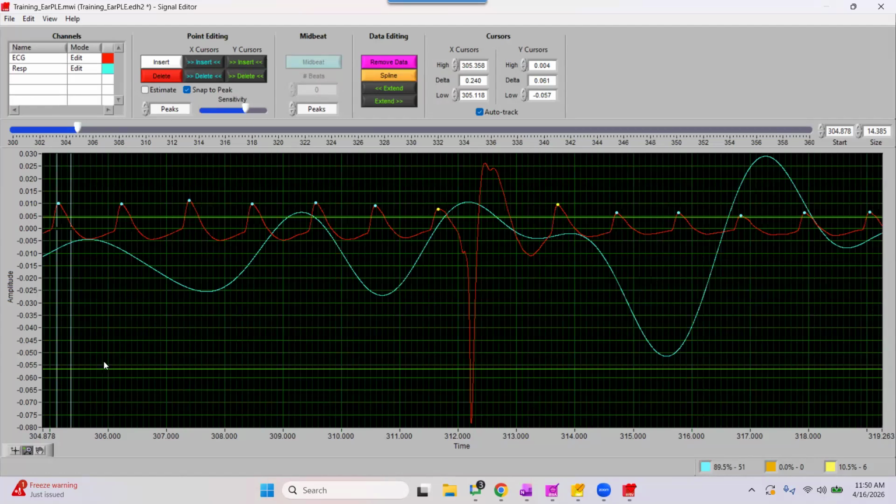So instead, what we are going to do here, similar to what we do with HRV, is that continuity matters. We need to make sure we string along at least 30 seconds of continuous data. Because of that, with this gap in time, we need to correct for it or add a mid-beat, or estimated beat, in order to use a placeholder here.